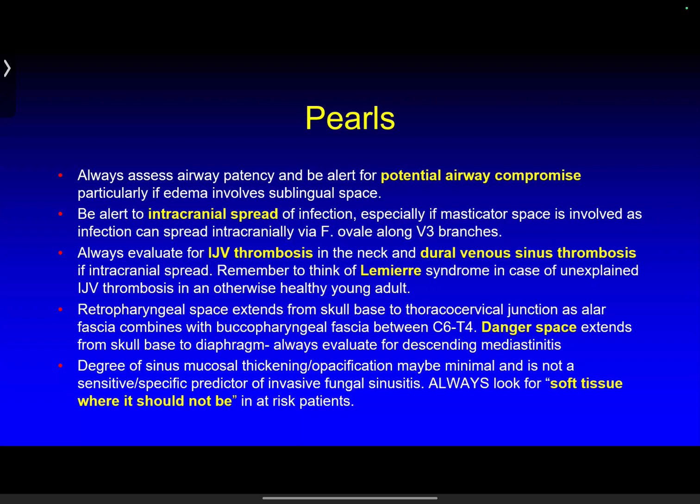So, frankly, I find that the best sequence to evaluate for cavernous sinus thrombosis, believe it or not, is a time of flight MRA of the head, which shows arterialized flow within the superior ophthalmic veins. And it always shows up. Of course, we do post-contrast imaging in most of these patients. It's best seen if you do fat suppression on your post-contrast, but even the 3D SPGRs post-contrast show it up very nicely. You just want thinner cuts through the cavernous sinuses.